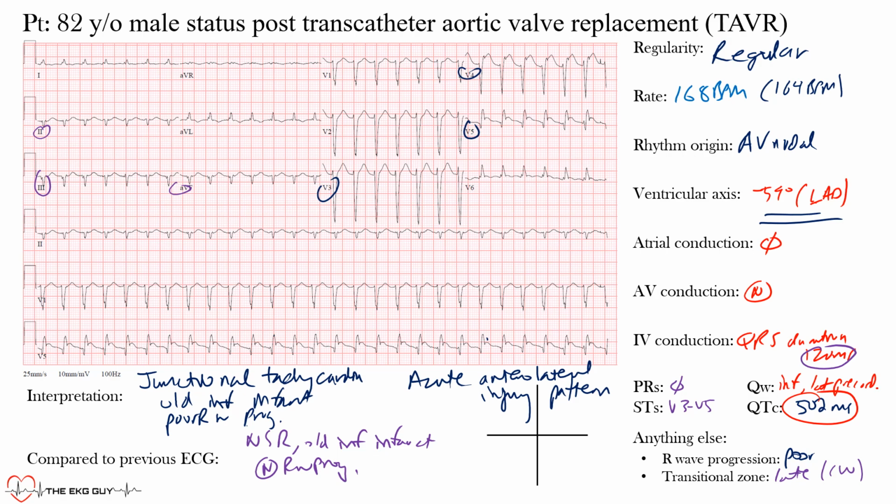Okay. Now this patient, just to give you some context, actually had this TAVR procedure, and then within about 30 minutes after had this severe chest pain, and they had to actually take him back because what happened is the valve that they put in to replace his aortic valve actually came back and blocked the left main stem artery, okay, and the left main coronary artery feeds both the left anterior descending artery and the left circumflex artery. And as a result, all these patterns here that we see are all new, all right, and this was quite an emergent thing, and they had to replace it.